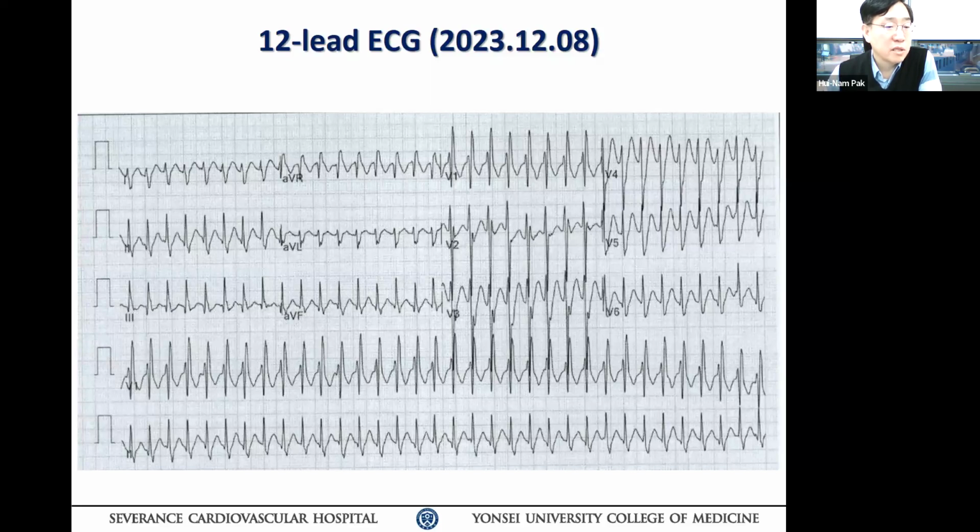그래서 아까 황 선생님께서 regularity에 대해서 강조를 하신 것 같습니다. 그래서 인터프리테이션 할 때 그런 부분을 꼭 염두에 두고 하면 고수답게 인터프리테이션 하실 수 있을 것 같아요. 그래서 항상 그 differential diagnosis를 하는 것이 중요하고, 그 다음에 EKG를 조금 더 디테일하게 보면서 계속 이런 exercise를 하시면 you will be good at it. Okay? 네. Alright. 갑시다.